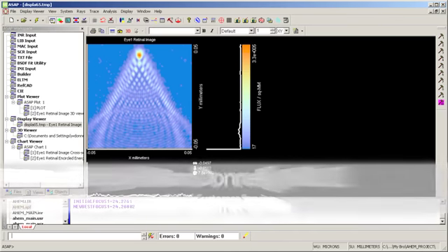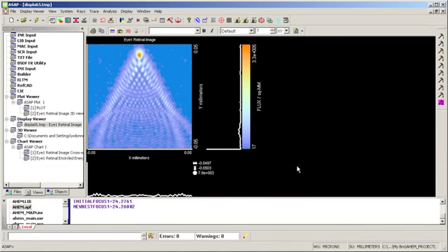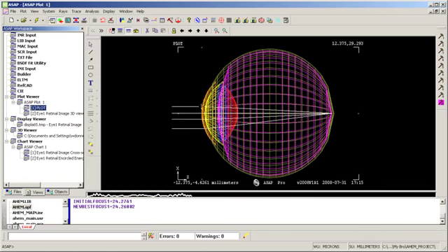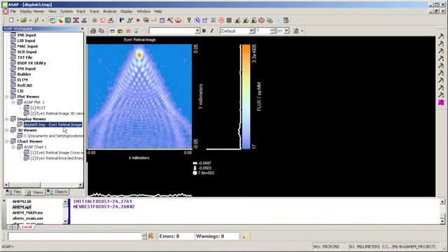We're now going to use the eye model to look at aberrations through a field or through depth. So here we're looking at the aberration coma that we've put on the cornea of the eye. We're looking at the image plane right here. Some aberration has been put on the cornea, and light has traveled into the eye. Here's a cross-section of that coma and an isometric view, and the display once again.